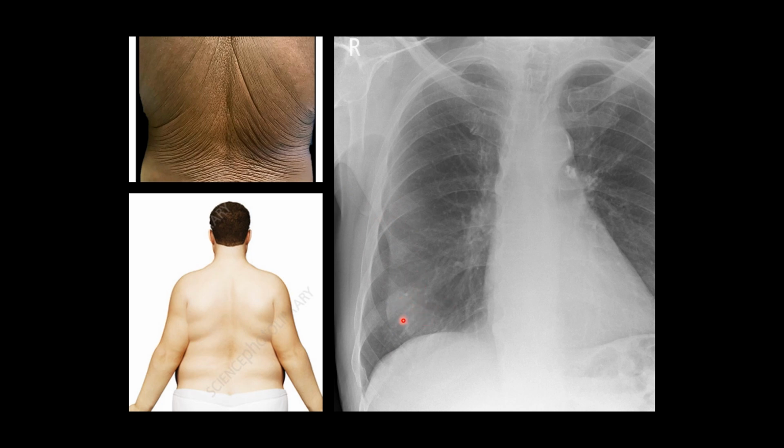The way that you would be able to tell that this is not a pneumothorax is, one, again, it's a thick line instead of a thin line, but then two, you can still see lung markings, especially right here. It goes past the line. You can see more lung markings right there going past the line. You will never have lung markings going past the edge of what the lung is. So this is not a pneumothorax.